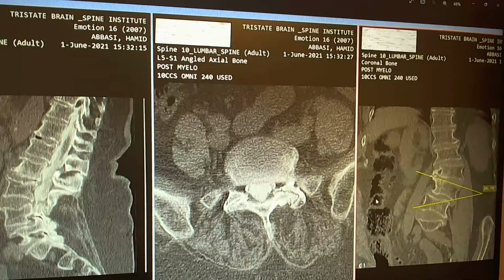Even though it is poorly visualized, it is the Cobb angle for scoliosis. Perfect. You can measure the Cobb angle in the coronal view, then you call it the coronal Cobb angle, or in the sagittal view, then you call it the sagittal Cobb angle. That is important if you are measuring for hyperkyphosis and so on. Excellent job, Christina.